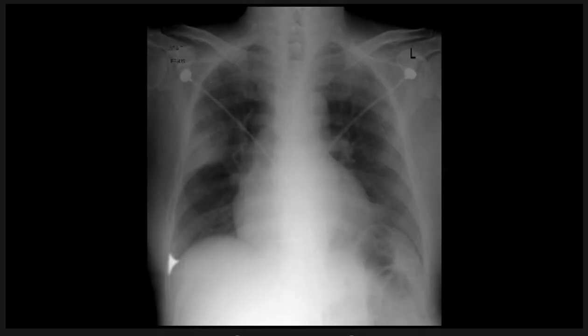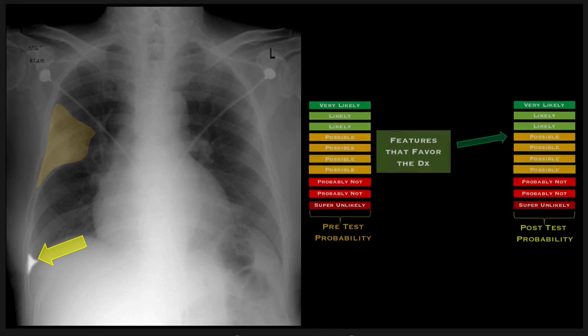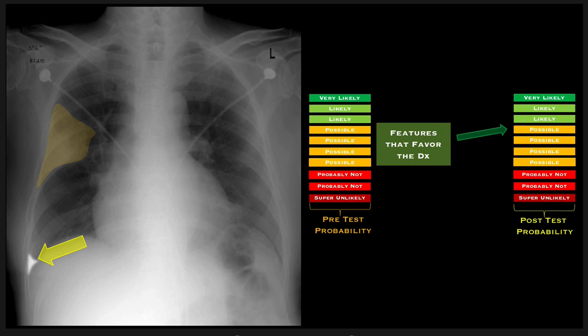So let's look at a practical case here. I already highlighted a little pleural effusion down there. And then we also notice we've got a peripheral opacity, sort of wedge-shaped maybe. So this could obviously be lots of stuff. We're going to run through our clinical algorithm like we talked about on the prior exam, and maybe this patient doesn't have a cough and doesn't have a fever, white count's normal, but they are acutely short of breath and they just got back from a long plane trip followed by a long car ride, and the D-dimer was positive.